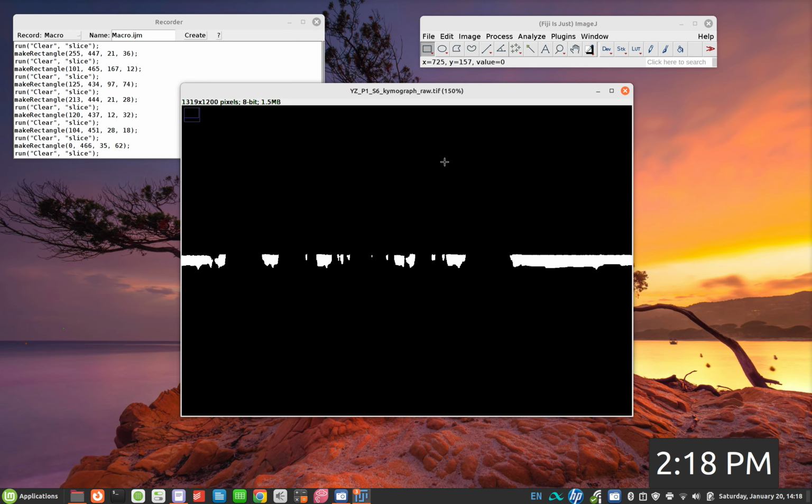All right. Don't leave the small dots even. Try to remove everything as you can. So every part that you think constitutes noise and not the data that we are interested in. But be careful not to lose any data that we are actually interested in. So this looks like a very clean representation of the velum's movement, basically capturing the gap between the velum and the velopharyngeal wall.